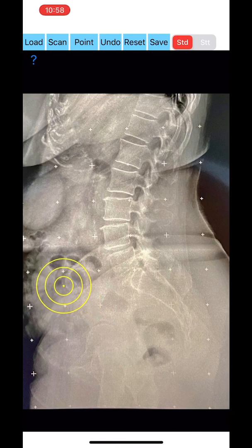By clicking the button, point over the 2 anterior superior iliac spines, ASISs, independent from site selection, left, right, and the pubic symphysis. Points P1, P2 and P3 are marked respectively on a lateral pelvic radiograph.